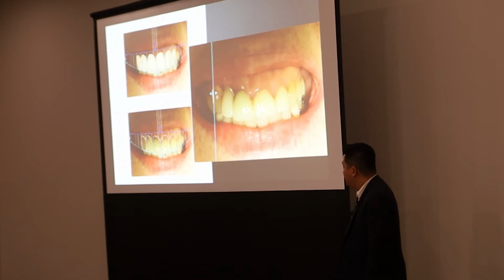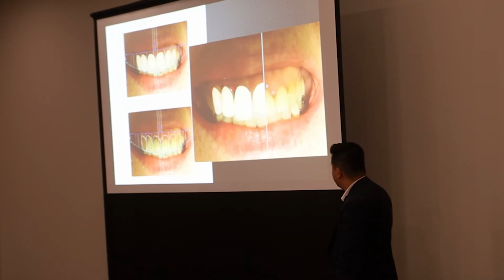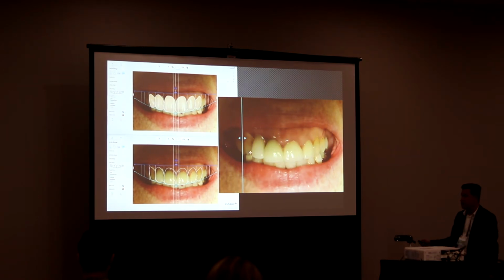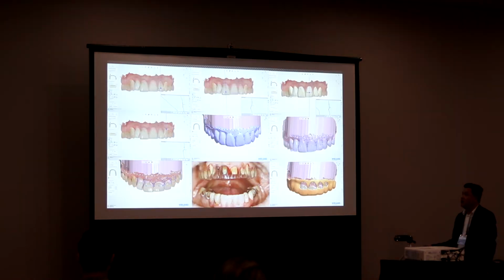So this one here, we had a case where we determined the patient needed some kind of crown lengthening. So what I'll do here is an initial 2D smile design again. I'll do a 3D digital diagnostic. And then, if they approve of that, we'll bring it in as a prep once again. And I'll just plain cut these straight across.